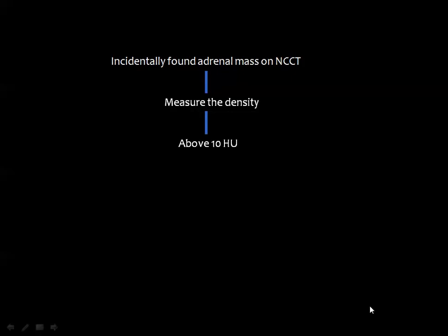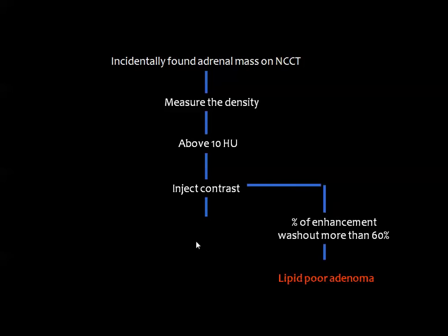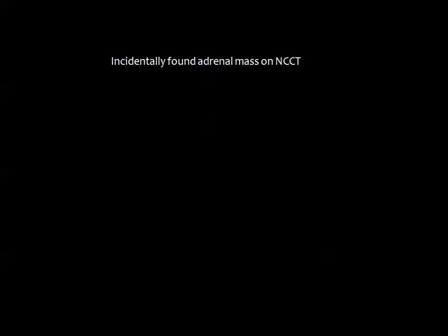Then, if you measure the density and it was above 10 Hounsfield unit, and then you inject the contrast, if there is enhancement and washout of more than 60% of the enhancement in the delayed 10 minutes, you can consider lipid-poor adenoma. If there is no washout, then consider the differential diagnosis, which includes metastasis, pheochromocytoma, adrenocortical carcinoma, adrenal lymphoma, and the granulomatous disease.